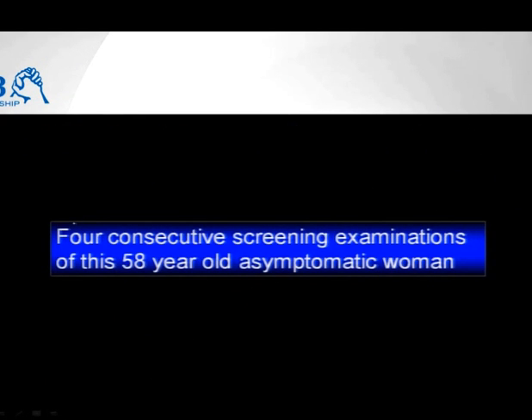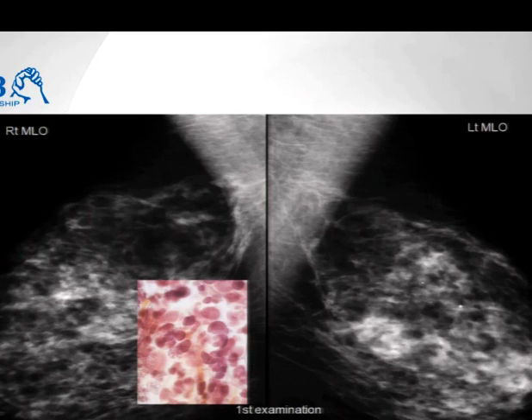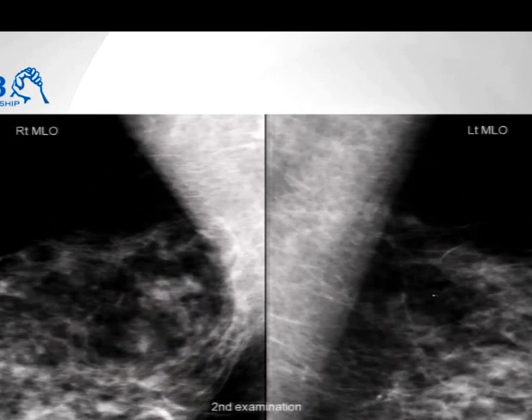Dear colleagues, now we are going to see case after case that are localized on the Milky Way. How do you want to learn? You learn from your mistakes or other person's mistakes. So let's see a case that was missed. But this is what we call pattern 4. You see these large terminal ductal lobular units, and you think in color, and you say, I don't see any abnormality here, just normal basic building blocks.